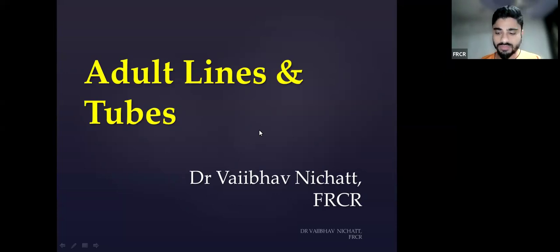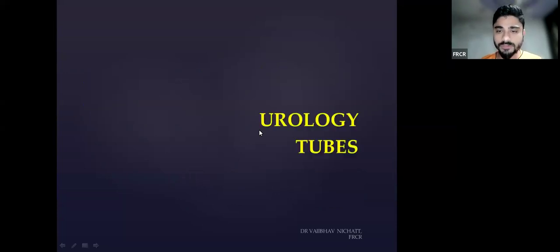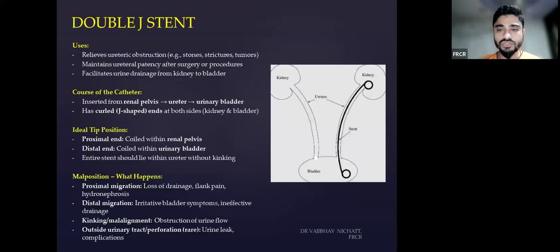Okay, so in urology there are only a few lines and tubes, so it will be a short session. It will be specifically important for FRCR shorts cases. So you should know the ideal position and you should be able to identify if you see any displaced or migrated lines and tubes as far as the urology part of the system is concerned.